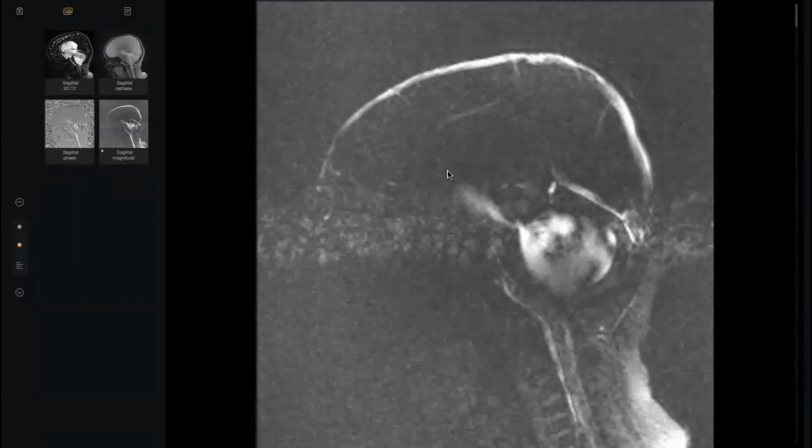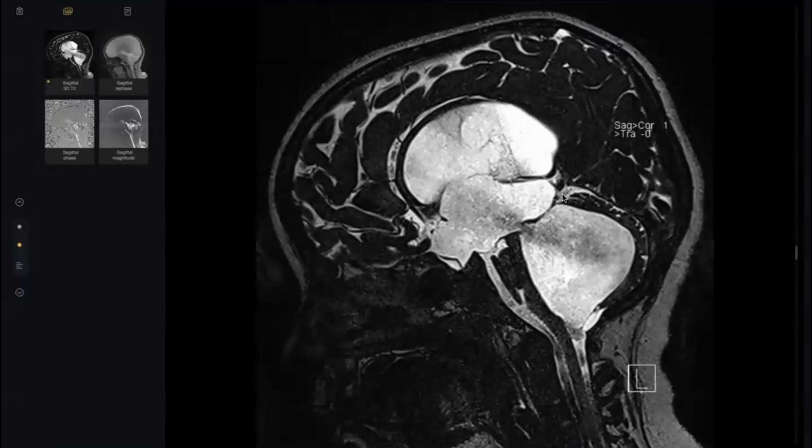So I think the pathology is below or at the level of the foramen magnum, which is causing retrograde dilatation of all the ventricular chain. Excellent, doctor. This is a communicating obstructive hydrocephalus, and we didn't detect any cause here. So the obstruction is below or at the outlet of the fourth ventricle.